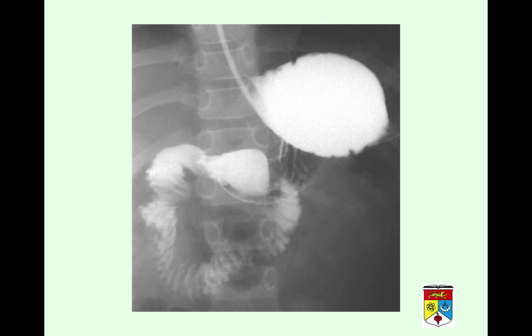So in a normal contrast meal, basically you will outline a normal stomach and you can see the rugae there. That's the antrum of the stomach with D1 here, and of course you will see this is the C loop, which is presented by the duodenum. That's the second part, and we know that the biliary system drains into the second part of the duodenum, and you have the third part of the duodenum that crosses the midline, and this is the duodenal-jejunal junction before it becomes the jejunum.